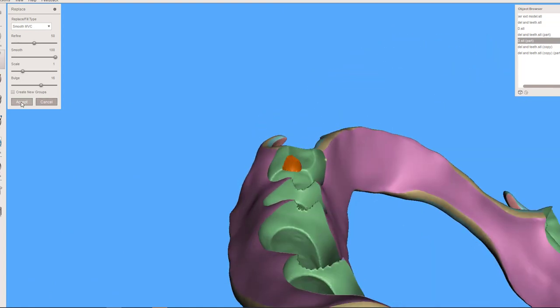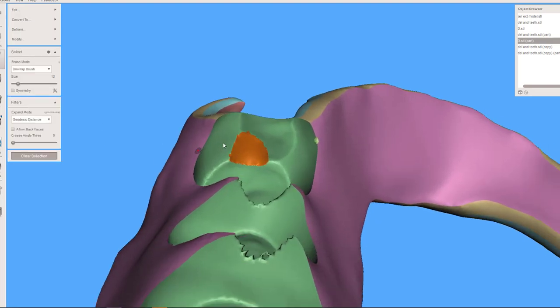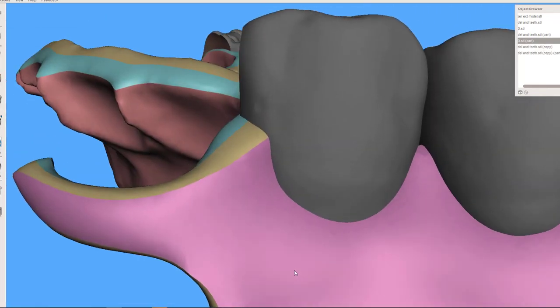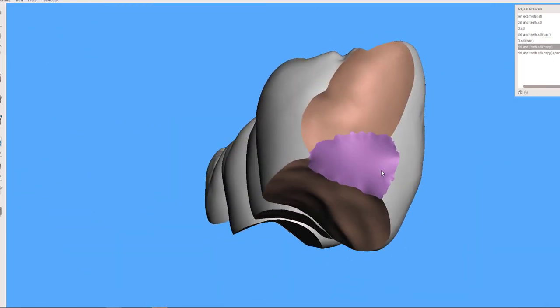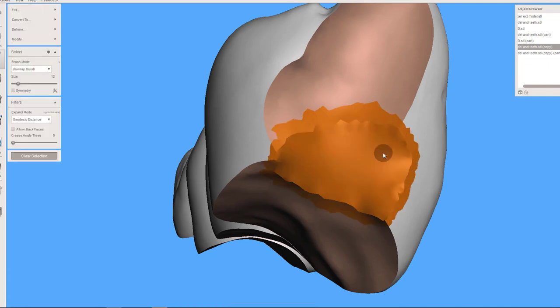That's so small that I'll just pre-adjust that tooth in that position. Or if I'm worried about it, I'll just, again, go ahead and take these teeth, and if that area is of concern, then I'll just take this, maybe I grab a little bigger part.